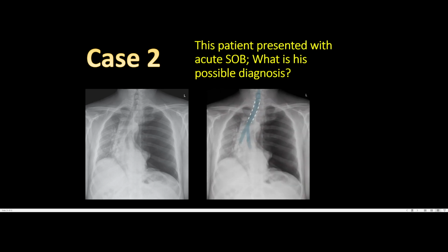So you can see the difference. The trachea and the mediastinum, including the heart, have all been shifted contralaterally. Oftentimes in pneumothorax, you'll see the visceral line of the lung. That means that part of the lung that's compressed, you can see the line of it, the visceral pleura. You'll see it as a thin white line, but it's not as visible in this picture because this left lung has been pushed towards the other side. So this is a severe case of left-sided tension pneumothorax.